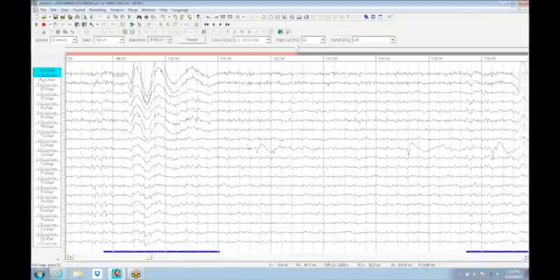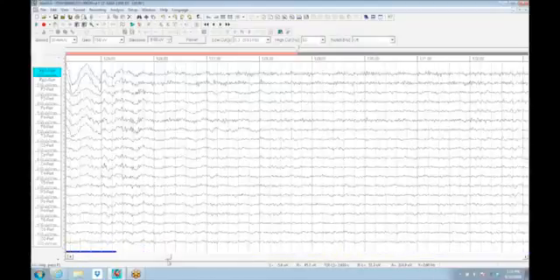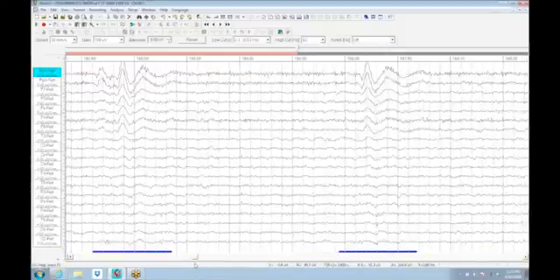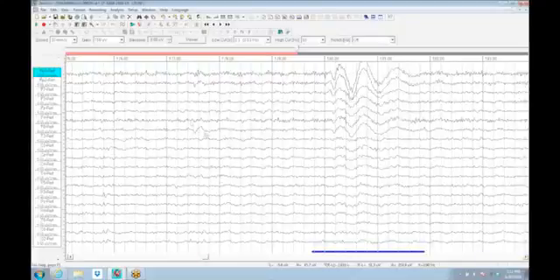This essentially ends up having a C3 electrode that's popping throughout, and that F8 electrode that popped originally has some instabilities as we go through. It's not as common as that C3 popping, but a rare little blip out of the F8.